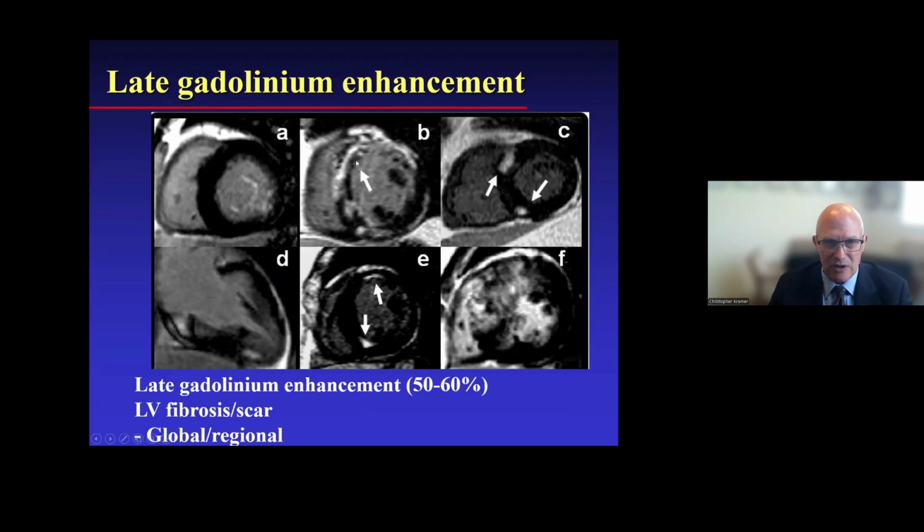Patient A has no LGE. Patient B has confluent LGE in the anterior wall, but there's subendocardial sparing. So this is not an infarction. In infarction, the wavefront of necrosis starts in the subendocardium and progresses to the subepicardium, and there's also midwall fibrosis here in the thickened septum. Patient C has the classic form of scar in HCM, which is RV insertion site fibrosis. Patient F has severe asymmetric septal hypertrophy as well as fluffy diffuse LGE there.